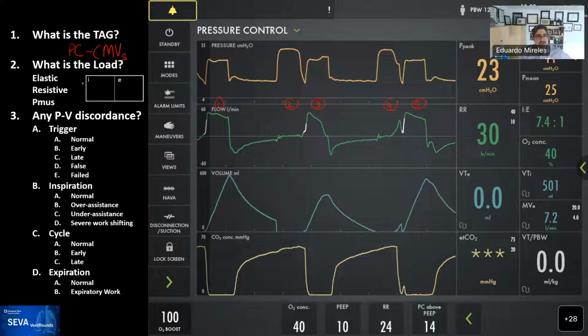The next thing I go to look at is the expiratory phase. When you look at the expiratory phase, again you see some amputation of the expiratory flow. Instead of looking nicely like that, it's missing the peak. But you can see the next one has a nice peak. And there's exponential decay, and it keeps going, and nothing happens.